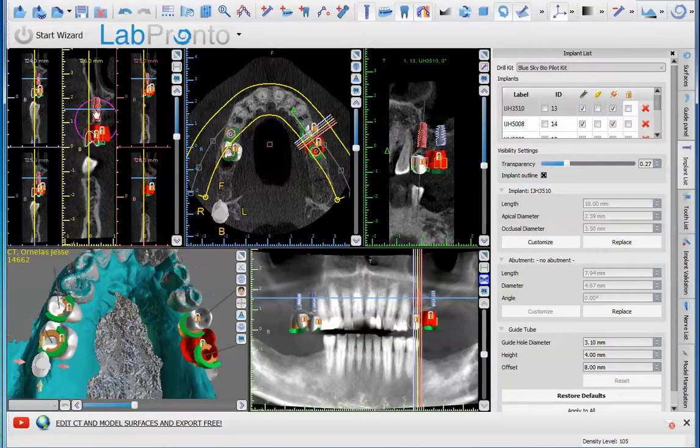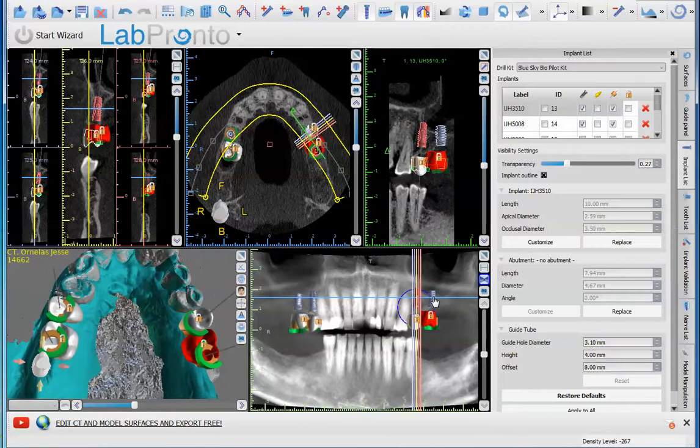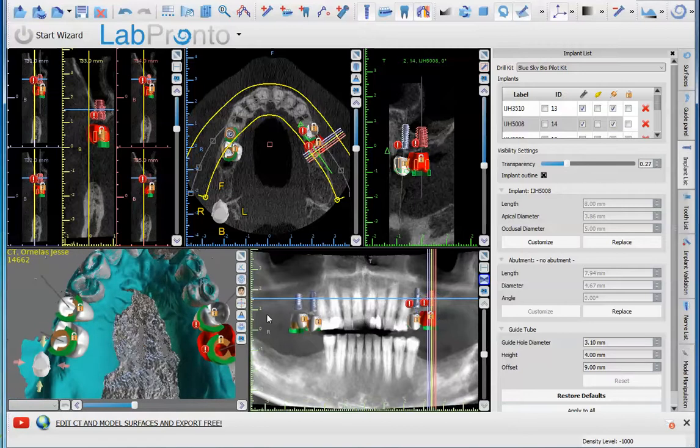And then maybe a little distally, or buccally rather. Looks better. Now we can change this molar. Get a little bit more in the central fossa. They're a little bit too close to each other, is what the software's telling us. So we can change the size of the teeth, make them a little bit bigger.